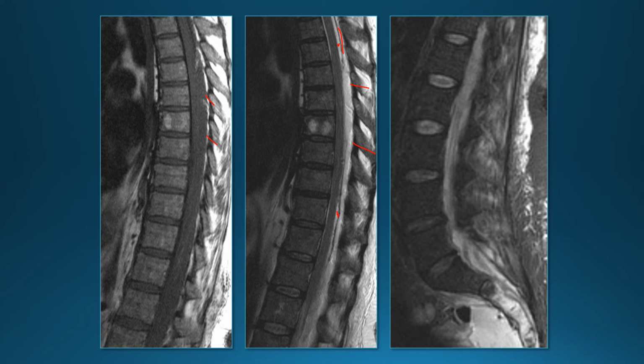In this case, the infection started in the pelvis. This was a patient who had this pelvic abscess, which spread to the sacrum. We can see osteomyelitis of the sacrum, and then developed a sacral epidural abscess that spread all the way up. Sometimes they can spread all the way up from the lumbar up to the cervical spine through the epidural space.